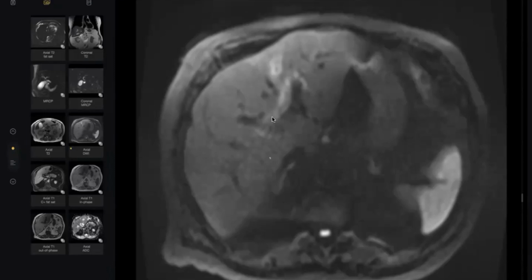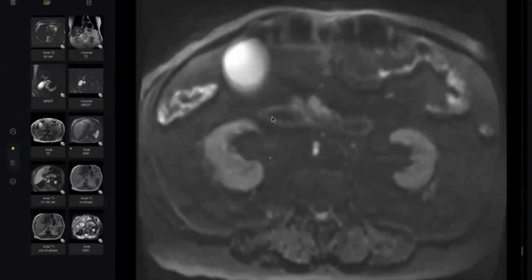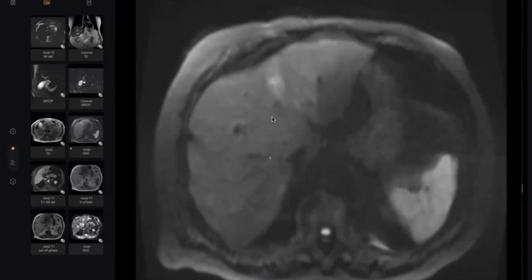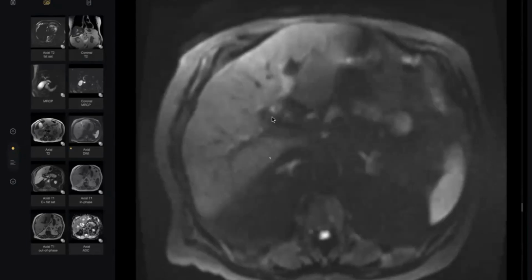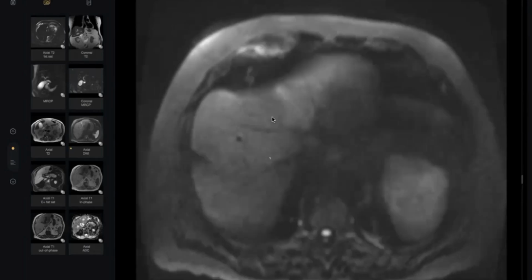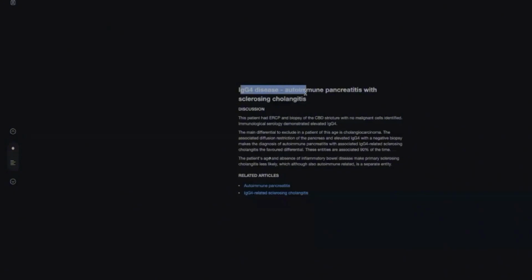Something autoimmune, sure. Autoimmune pancreatitis. Okay, which autoimmune disease? Sir, I can't remember. Did you hear before about IgG4? Yes, sir. This is IgG4 disease, consisting of autoimmune pancreatitis and sclerosing cholangitis.